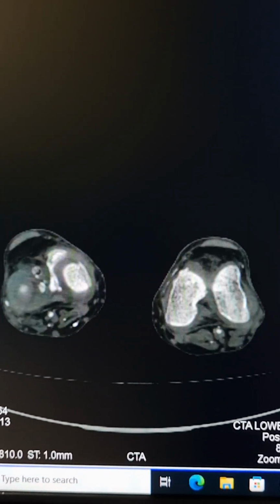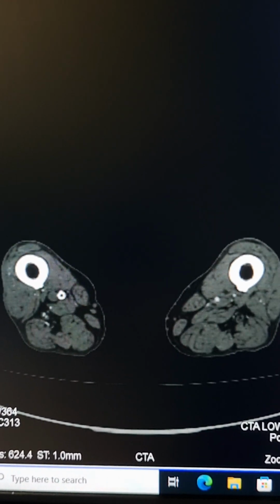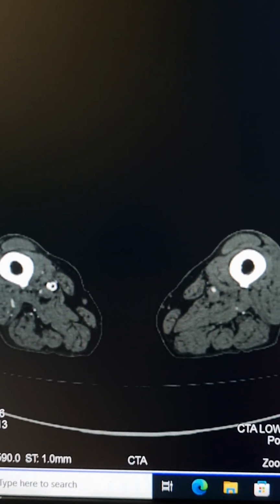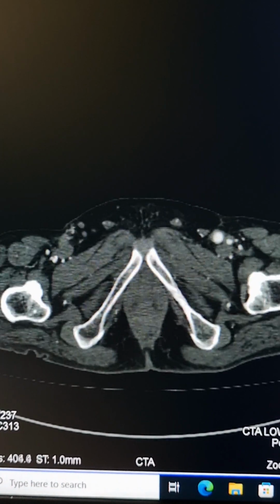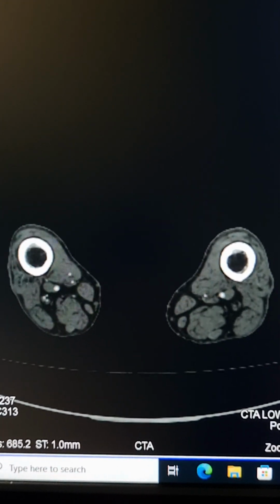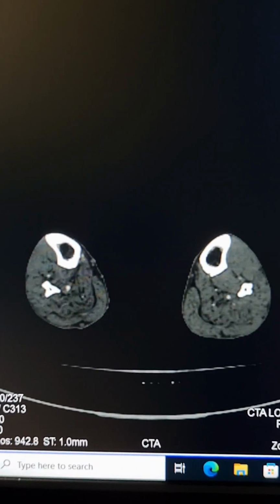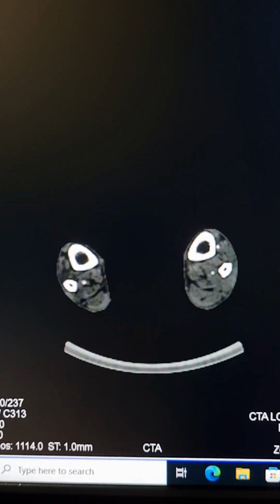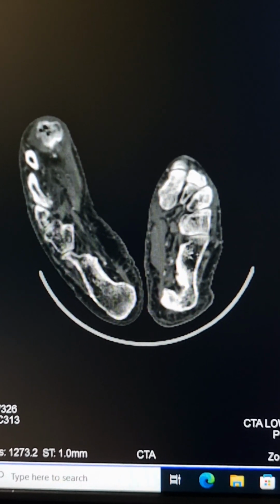But obviously, since there are proximal, moderate to severe luminal narrowings on either side, and the vessels obviously are blocked, the superficial femoral artery on the right side and the external iliac on the left side, on Doppler examinations there will be low velocity parvus tardus type of blood flow in these blood vessels. But obviously, we cannot trace these blood vessels as effectively as we are seeing on the CT angiogram.